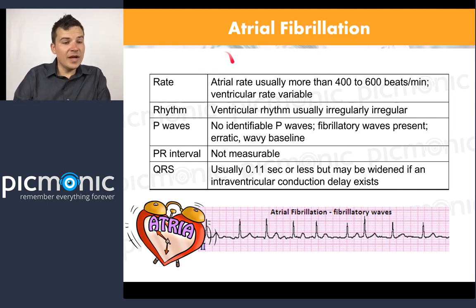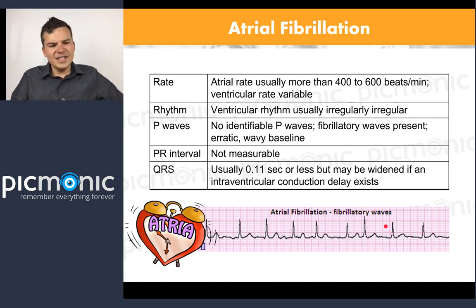Well, let's look at the rate. Follow the exact same process. Don't skip ahead. There's a QRS right here, by the way, right behind this little atrial heart alarm clock, who's freaking out for fibrillation. So what's the speed here? 1, 2, 3, 4, 5, 6, 7, 8, 9. 9, right? Sorry. So there's 9, so the ventricular rate's about 90. Okay, let's just go with that for now.